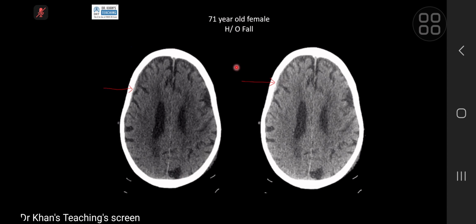And I will show you the coronal. And on coronal, this is the usual window, and this is the subdural window, more convincing if you see here, and particularly if you see here. So this was missed. And this is just to highlight on axial and coronal, the same thing once again.